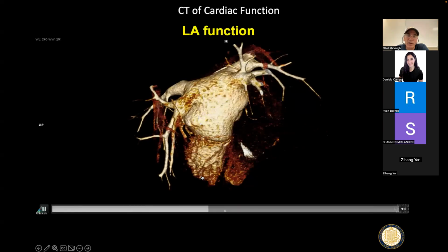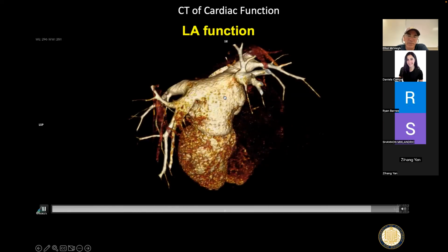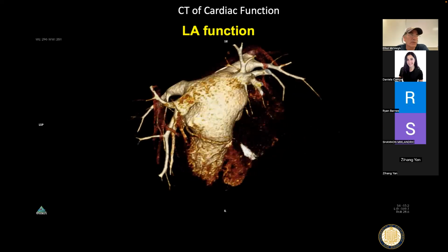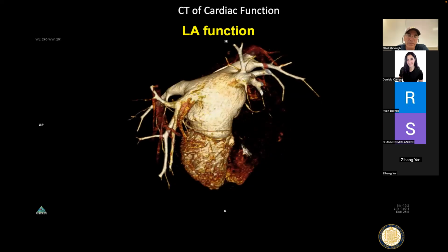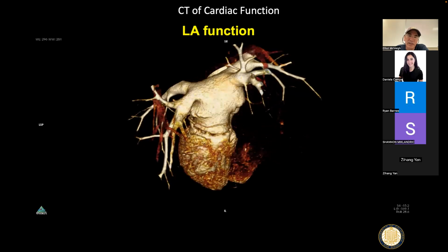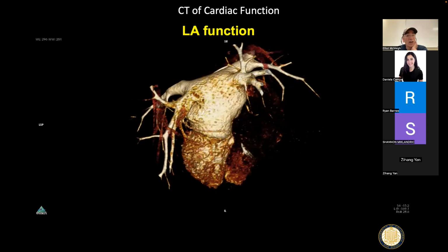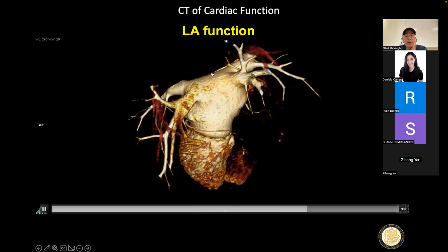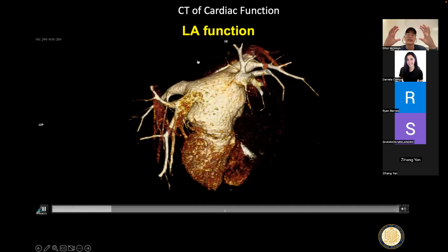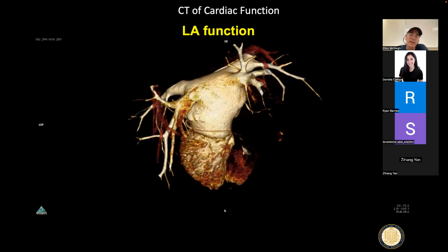So the question is, if you've got a CT movie and you can look at this patient's left atrium with this kind of detail, shouldn't you use this information to decide whether or not the blood flow in this left atrium is compromised and could lead to a stroke? You can see this is a cine of 1 heartbeat, and this patient is not in atrial fibrillation because their atrium, if you look at the top of it right here, it goes boom, it contracts, and so it actually has a P wave and a normal atrial contraction here.